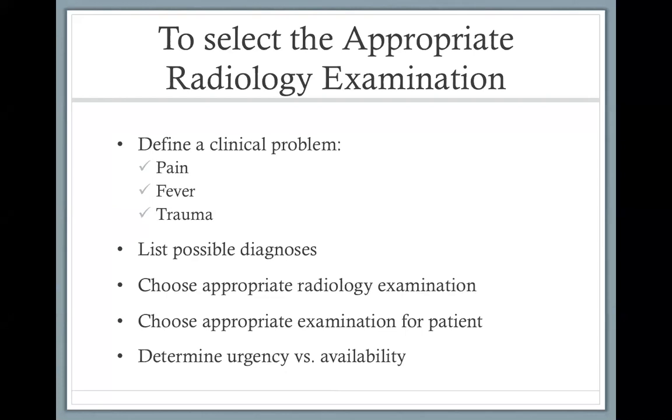So we think about tumors. And that's why when we saw the abnormality, we also wanted to give contrast. In the lady with the shortness of breath, we thought about pulmonary embolism. We could have done a chest X-ray, but at the end, the appropriate diagnosis is with CT.